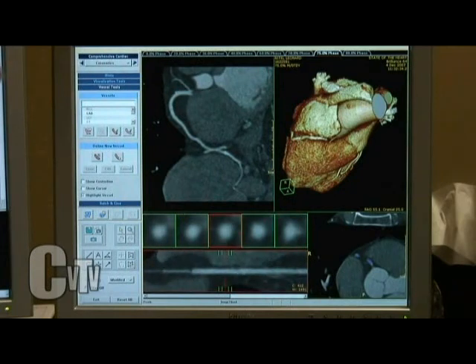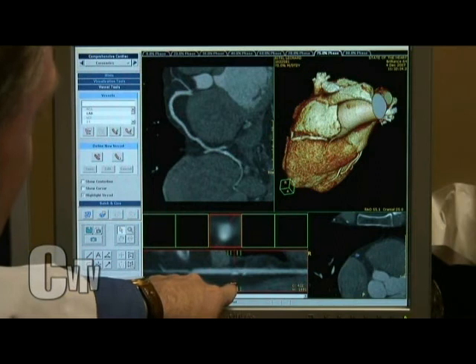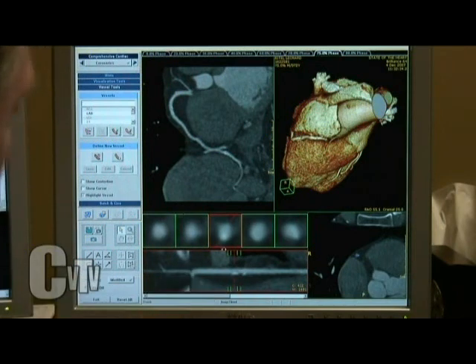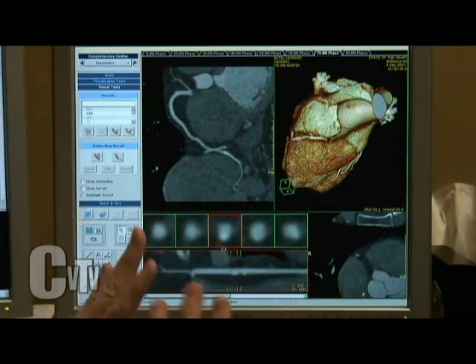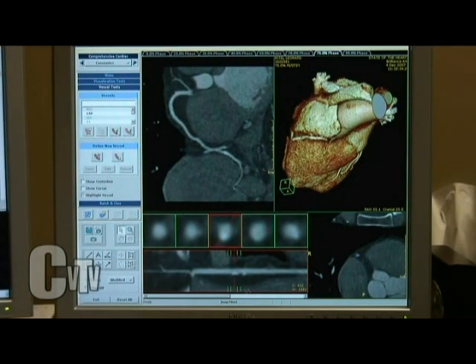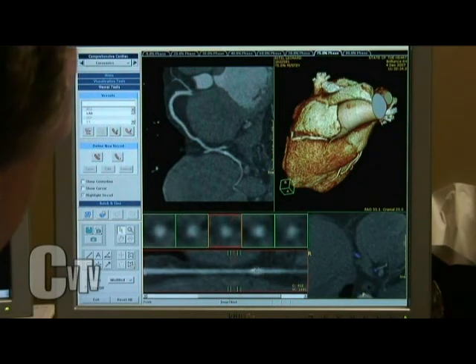I'm getting there. Yeah. So here, he does have some other plaque here. Again, this is stuff that is in the wall. You can see here, it's growing outward. If I did an angiogram on this blood vessel, couldn't see it. Nope. Couldn't even see it. I wouldn't be able to say, gosh, do you have plaque or not? That's amazing. And then here, again, you can see literally the vessel's gotten bigger.